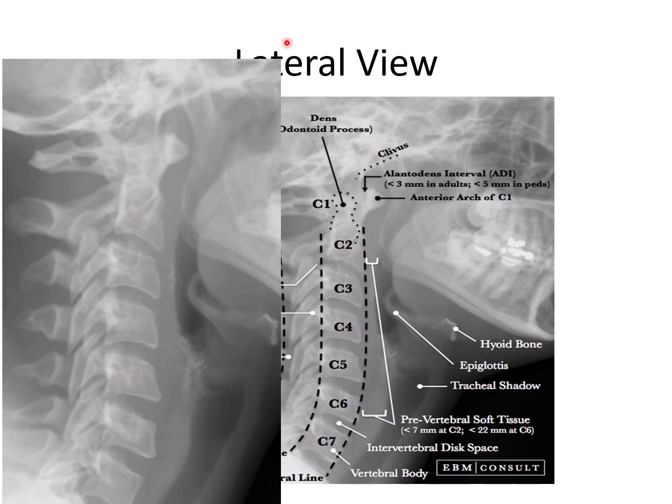After seeing vertebral body height and shape, see for the intervertebral disc height. It should be equal in height at all levels. If it is narrowed or widened, then think of degenerative change or pathology. If there is intervertebral disc narrowing, then this is due to degenerative change, and if it is widened, then think of ligamentous injury.